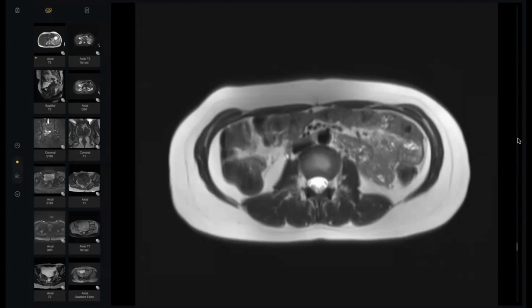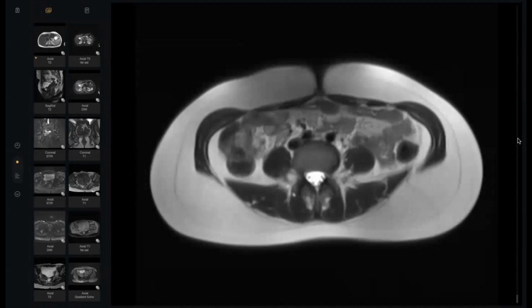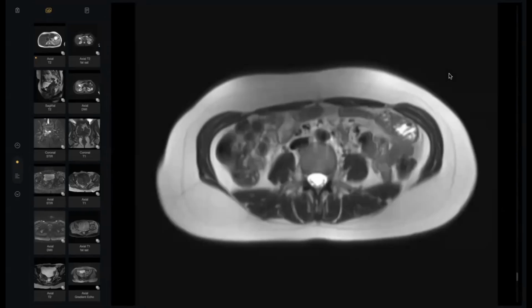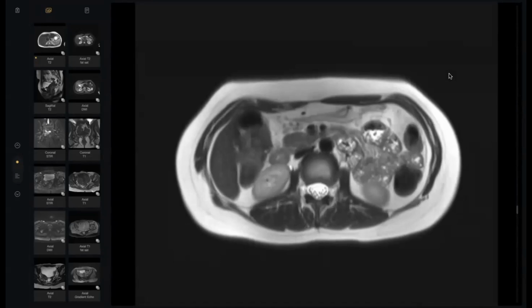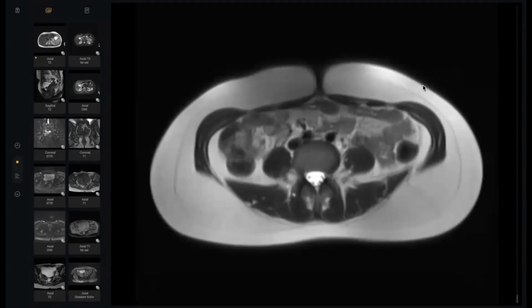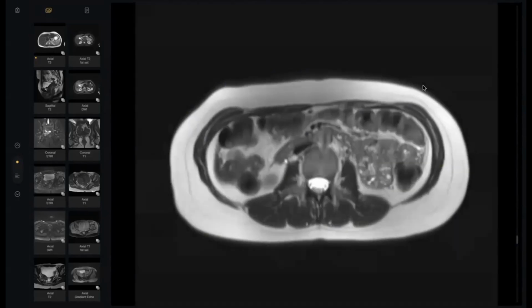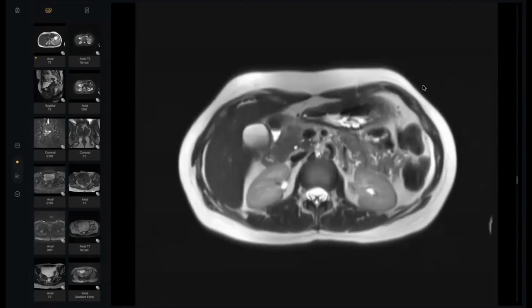This is an MRI T2-weighted image in a patient 26 years old with a history of pelvic pain and abdominal pain. I will scroll down till the last cut. So that's it, up till this level. In this MRI image, it is getting stuck. I'm not able to appreciate anything up till now. I will take a look once again.